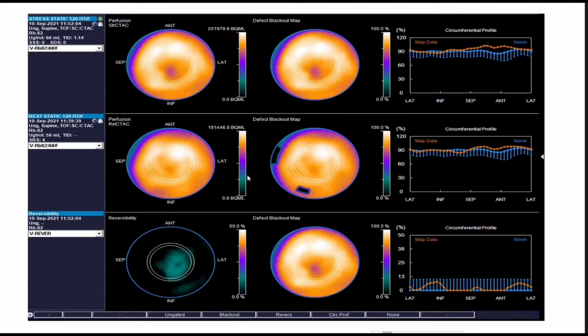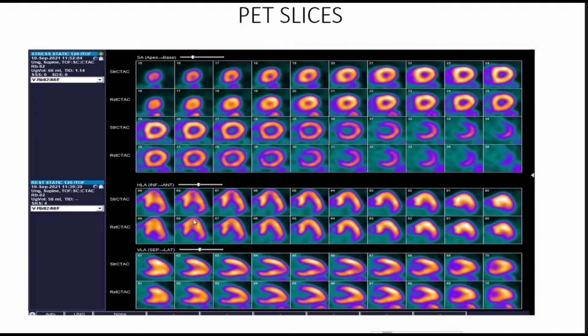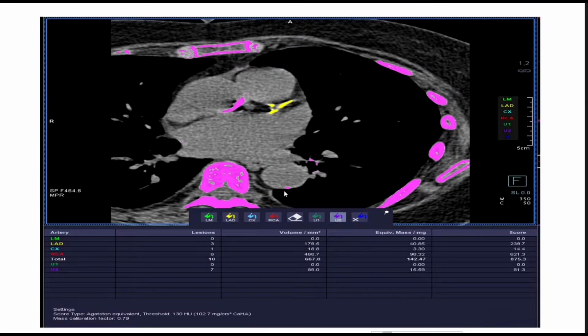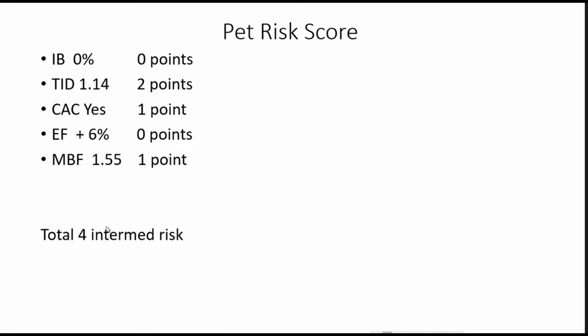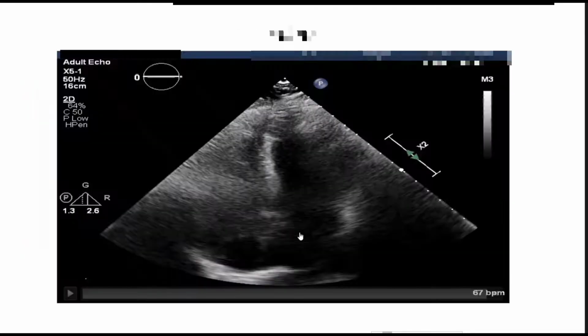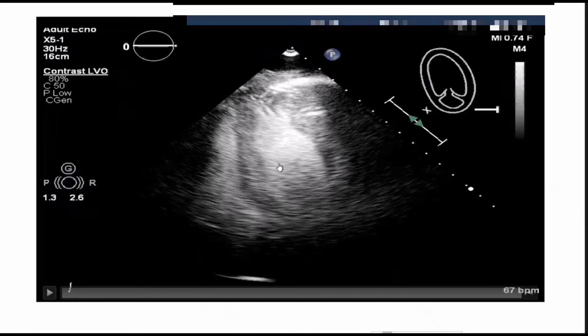However, when they did the PET, they kind of missed the subtleties here, which, we see this ischemia at the apex and we see it here. We see the shape of the ventricle. And then with that EKG, I mean, it all adds up. And so the risk score identified something was going on. It clearly wasn't coronary disease, and the echo confirmed it with the utilization of contrast.